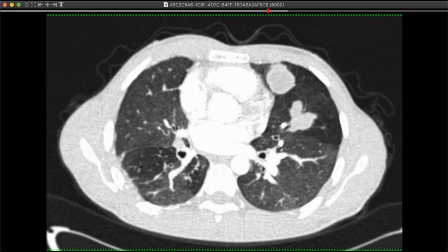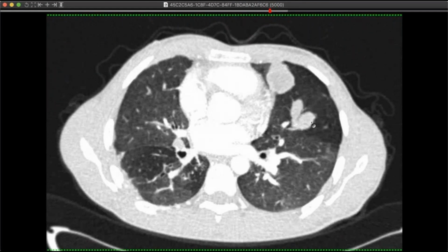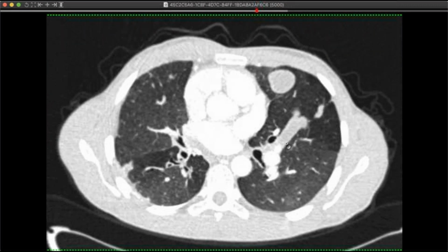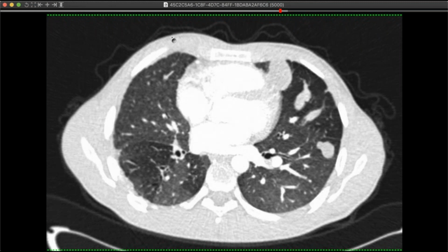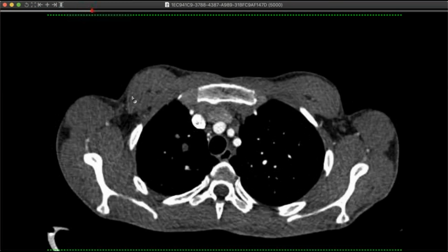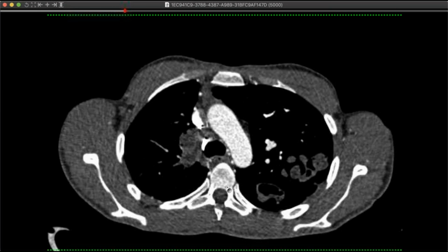So it's kind of sandwiched in just next to the airway. So you can follow the airways following this. I can't figure out if this is arterial, or if this is, I think it may be lymphatic, this stuff. And now I'll show you the soft tissue window settings, if it'll pull them over. Okay, don't crash on me. Here we go. And they're extremely low attenuation. I mean, very, very low attenuation.